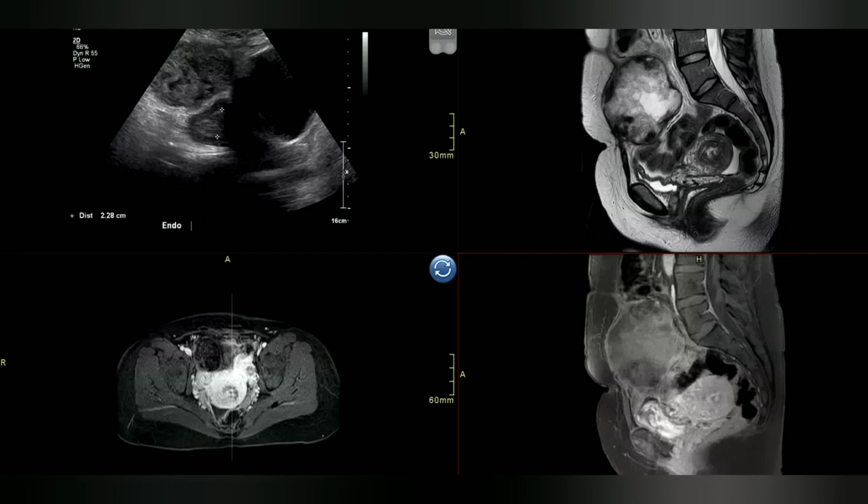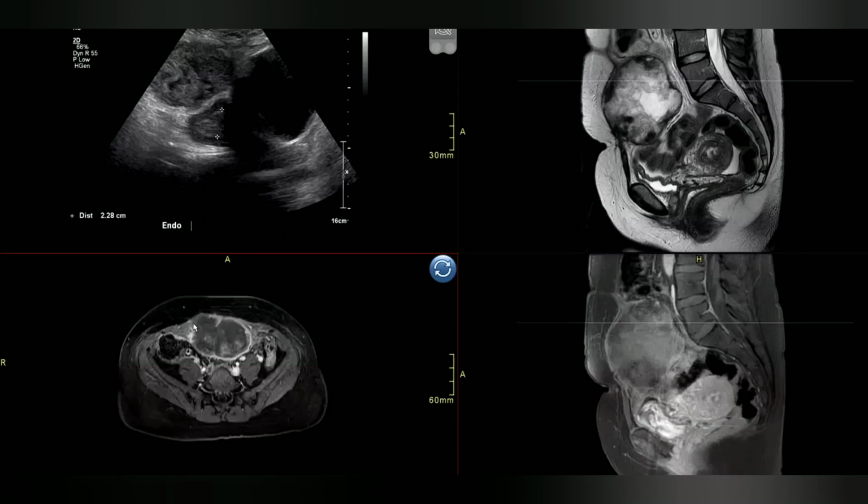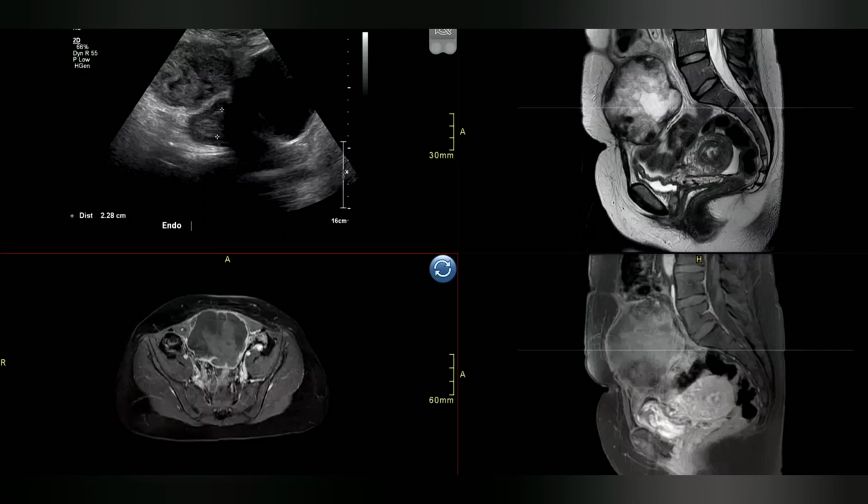There is no enhancement of the lesion which is outside, noted anteriorly or superiorly. Okay. But what is peripherally enhancing? Yes. And some heterogeneous enhancement is also noted within the lesion. Yeah, this is her scar.